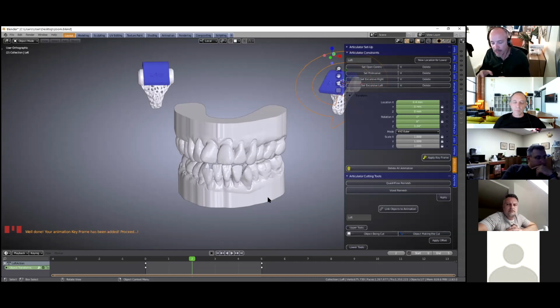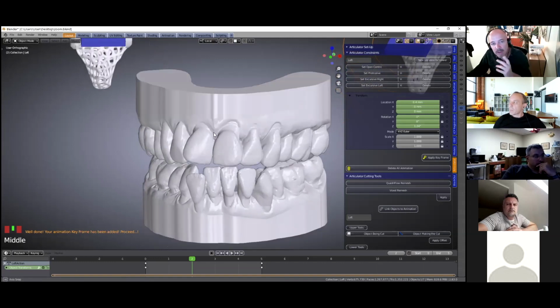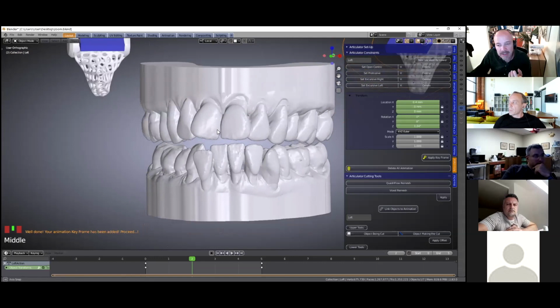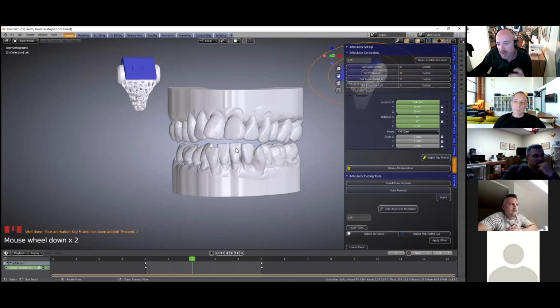If we had the jaw clenched in centric relation, and then we wanted to set the movements, that's completely different, because we want to get the movement according to the curvature of the top anterior teeth, for example. That's right. That's very different, because then we would set the mesh accordingly, but we can discuss that some other time.